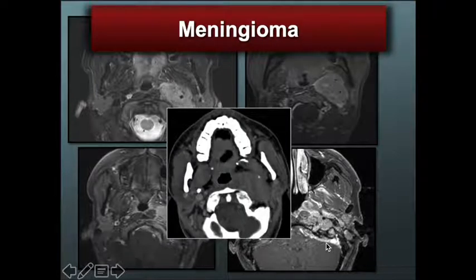And it is an extracranial meningioma. Extracranial meningioma, although rare, can easily extend into the distal carotid space and should be considered within the differential diagnosis of the lesion you see in this location.